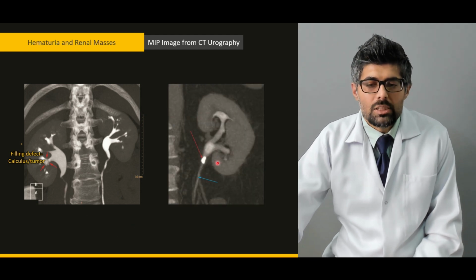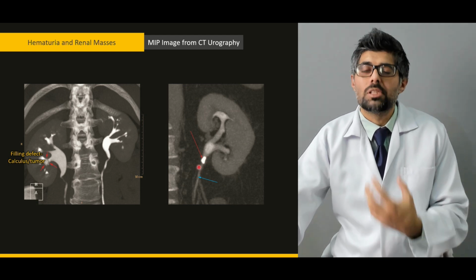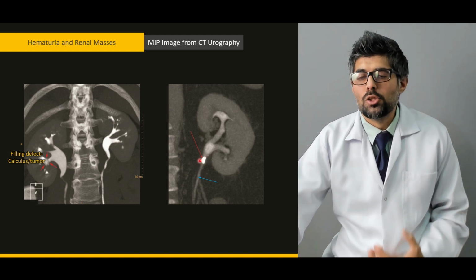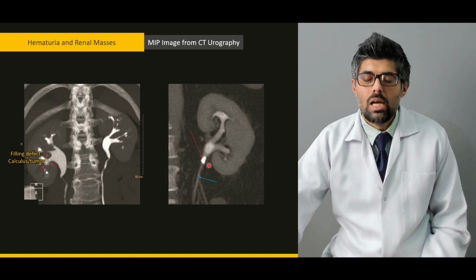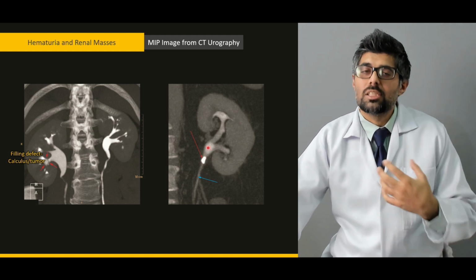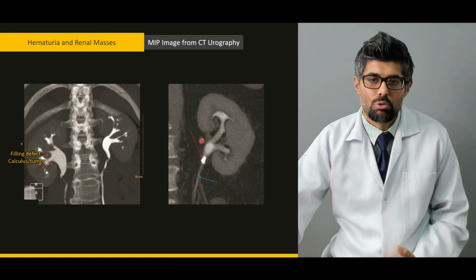Next example is the one inside the ureter. Now this is not an impacted calculi. This is a calculi of an irregular shape with spikes, and it is damaging the ureter. Now because it is in the ureter, some dilation of the pelvis is happening, but some urine is passing through the ureter. And because of its spiky irregular nature, it is damaging the ureter, and the blood is flowing through the ureter into the urinary bladder, and that is resulting in hematuria.